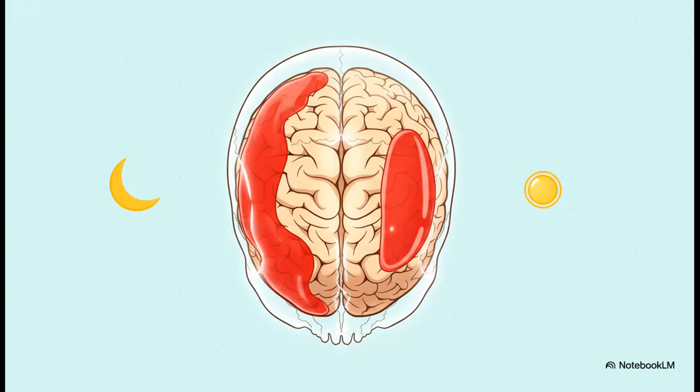And this is the key visual difference on the scan itself. A subdural hemorrhage looks like a crescent, and it can spread out across the brain because it doesn't care about the skull's suture lines. An epidural, though, is contained by those sutures. It can't cross them, so it's forced into this tight, lens-like shape. That one little detail, whether it crosses suture lines, is a massive clue.